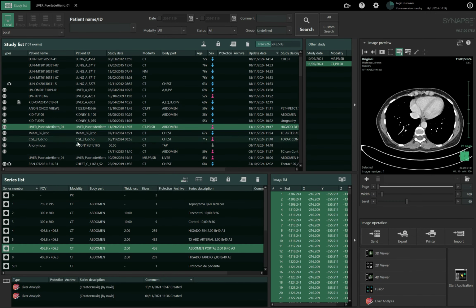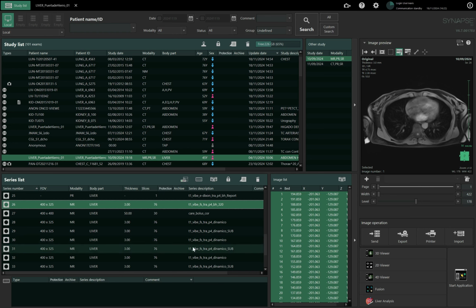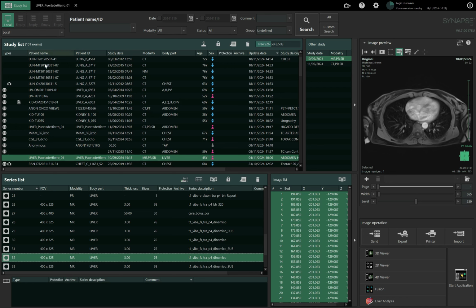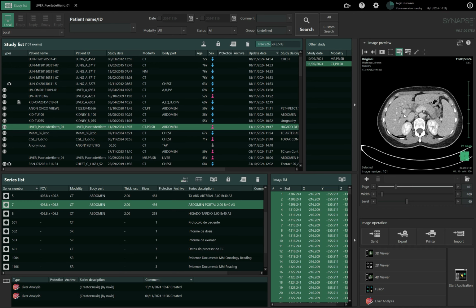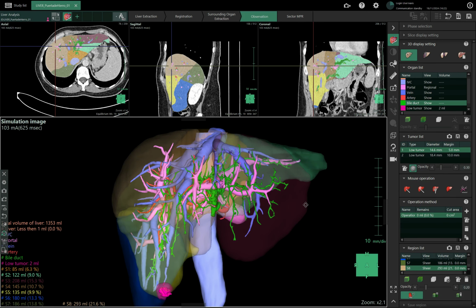Even so, I had some MRI cholangiography here, I think it was one of those. I don't remember, but the extraction was so bad there, and the visualization from the CT was good enough. You can see the bile duct here. It's really easy to see in this case, it's these fatty parts there. So the extractions were so good that I didn't modify anything. This is just the result. Still, I need them to check and compare this with the other vendor, but I have good expectations.